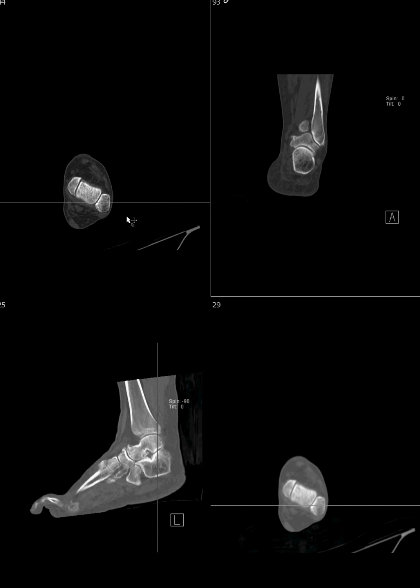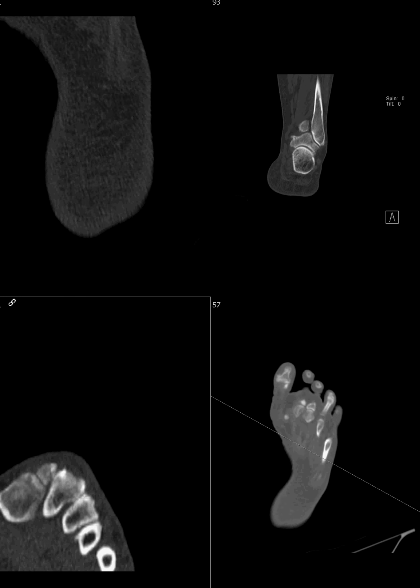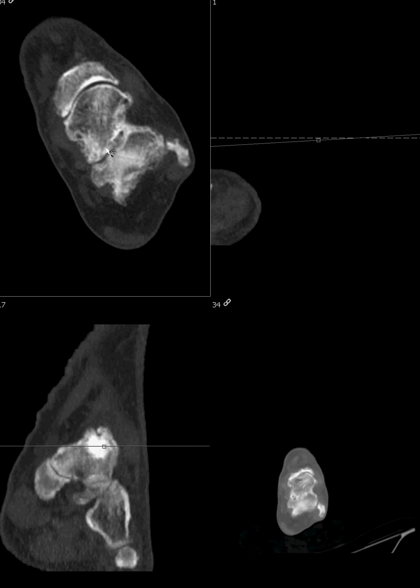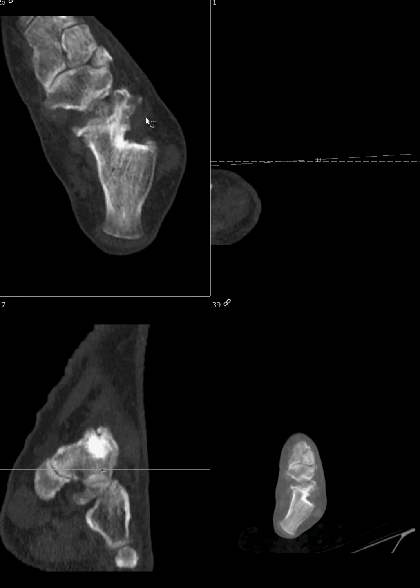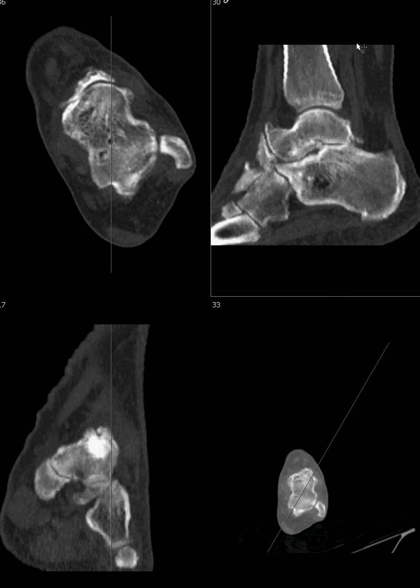So if you prescribe off these axial images and you do it this way, those would turn out to be coronal images, and if you did it perpendicular to that line, those would be sagittal images. So I did wind up doing that, and these are a little bit stair-steppy maybe, but just to show you what they look like. So first of all, I narrowed the field of view a little bit here because we didn't really need the whole foot.